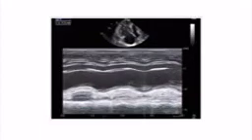And here's an example of a patient who has a reduced TAPSE. You see that these excursions are much less. Again, we'll measure from here to here, and the value is definitely below 16. An example of a patient with reduced right ventricular function.